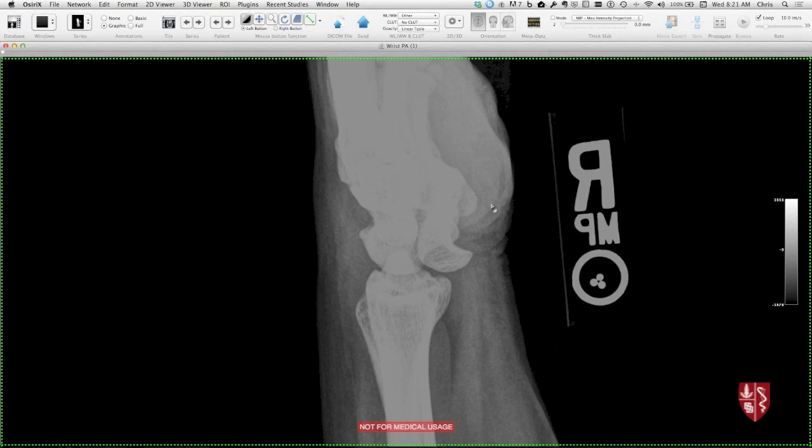Yeah, right. The lunate is actually markedly abnormal. So the lunate is here. Here's a little moon, and it's kind of facing forward. So the whole lunate is dislocated from that proximal carpal row. And there's a different spectrum along these lines, from partial or perilunate dislocation all the way to lunate dislocation.